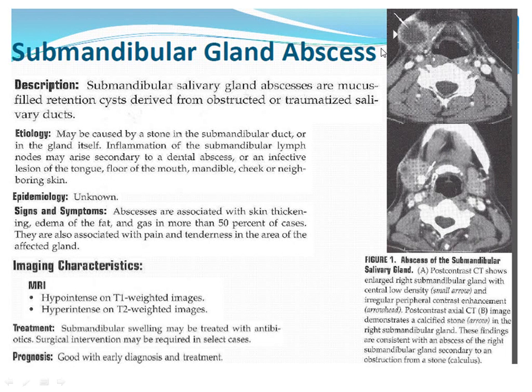So that'll appear, rather than being a T2 hyperintense area within it, it'll just be overall kind of larger than the other side and a little bit more edematous than the other side. And you'll see a bunch of little folds within it. The major thing that you're looking for in those ones is that it's just asymmetric from the other side. It's fortunate that a lot of things are symmetric in the body. There's a little bit of variability in the size of people's submandibular glands and the signal intensity of people's glands, so sometimes you just have to look at the other side. But of course, if you saw a really well-defined collection, then you'd know it was an abscess.